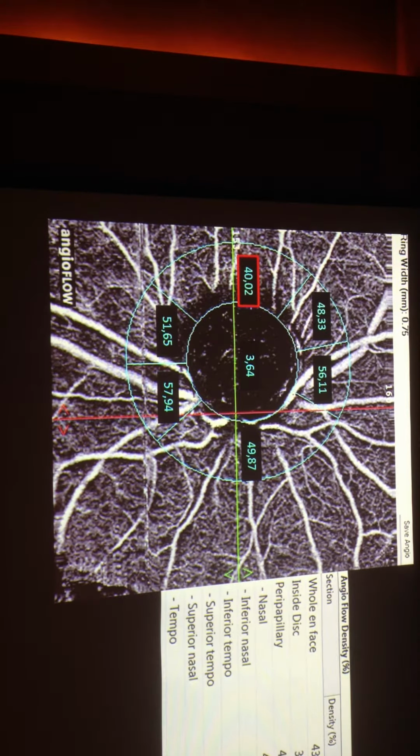flux index. But the rule on the flux index takes this one into account. So we prefer to take into account these different values around the disc. And so now we probably have an objective analysis of this part of the vascularization.